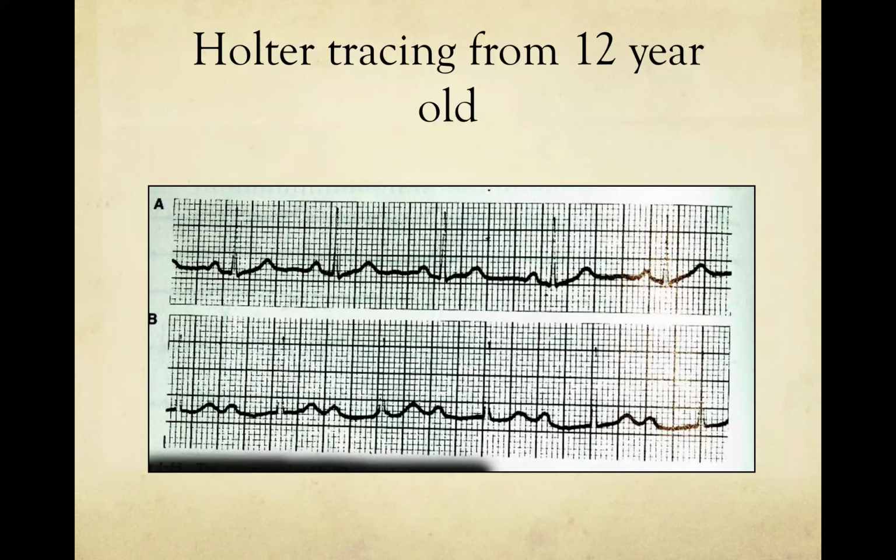It's hard to say. When you're looking at a small little strip, you don't know what's happening before or after. And we're only looking at a single lead of the electrocardiogram, so we don't really know for sure if the QRS morphology is the same. In panel A we can pretty clearly and definitively say that there is conduction with normal PR interval, versus panel B where there is not a normal conduction.